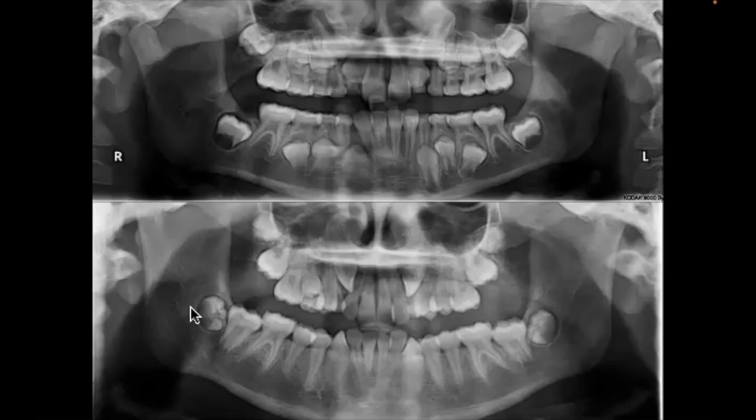Okay. How did we do? How do our canines look? Yeah. Or another word for that might be impacted. Yep. And our lower fives came in. All right. So that's good. You can see rotation of the lower canines as well, like quite a bit of crowding.